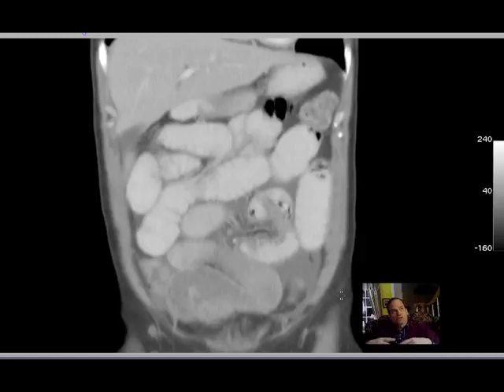regular ascites, like you get from cirrhosis, tends to be between -10 and +10 Hounsfield units, but occasionally an exudative type of ascites, meaning where it's kind of being pushed out from an organ, such as pancreatitis, can give you an ascites that's a little higher, in the teens, for example.